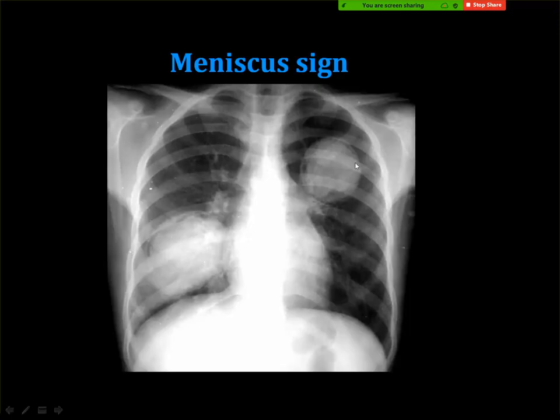The fungal ball: there is some air that is larger than this, and the ball is a little bit smaller than this. But this is air in the wall of the lesion, and you see sometimes, actually this is one of the old cases in my archive, but in the current days I didn't see a similar case. This is quite different from the fungal ball.